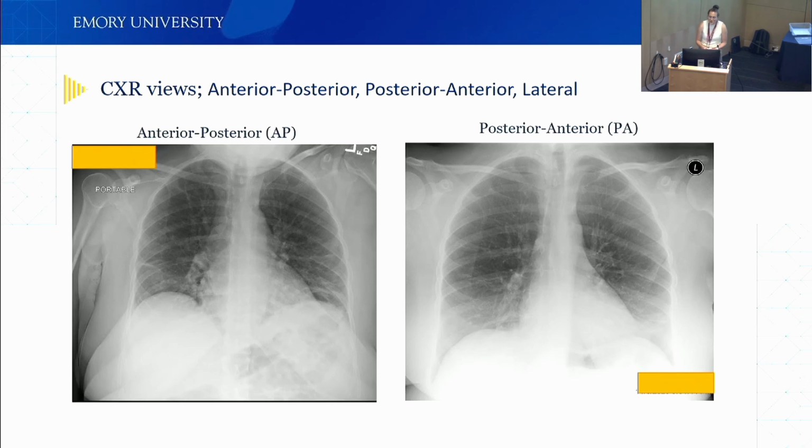Yeah, you can also tell by that the lungs are slightly darker, and that you have less space here. Like your diaphragm is a little higher, and that's from the back to front or front to back portion of it.